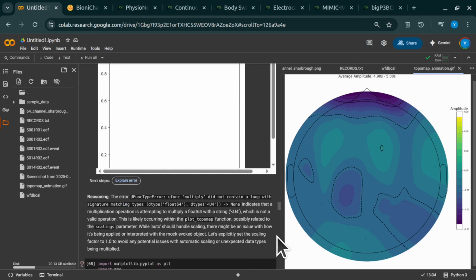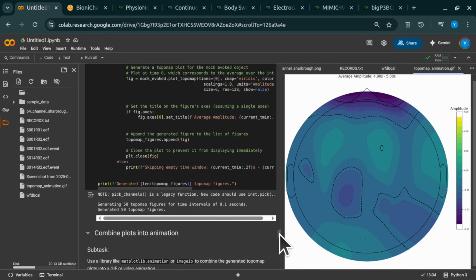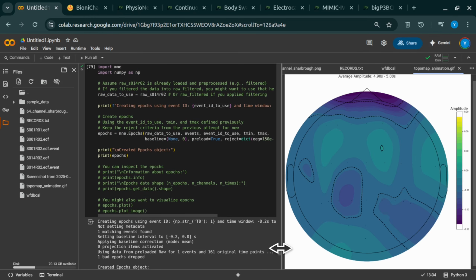Okay, so epoching conquered, at least for one event. You have data you can see. Now, the really fun part, bringing it to life, right? Making it visual. Absolutely. But first, a quick sanity check. We did that channel check, comparing the names from our WFDB calibration file against the standard 1005 montage map. Did they match up? Mostly, yes. Lots of common channels, but there were some discrepancies, some differences in naming or maybe placement.